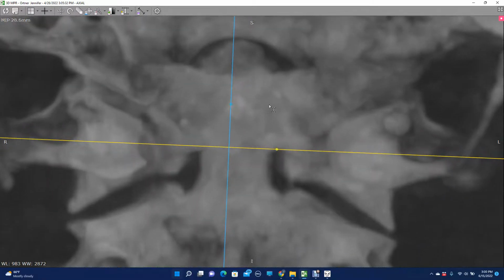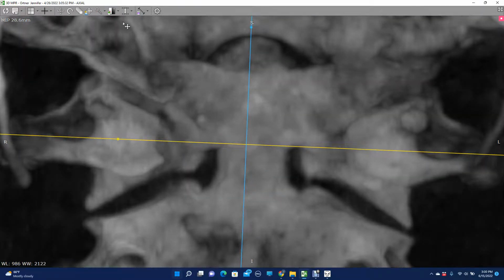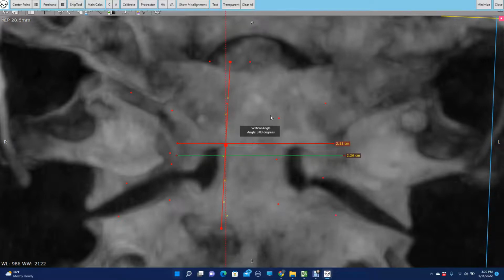What we're going to do is get this image totally ready to be measured, play with any type of shading you might want. The only thing that's super critical here is that we use the measure tool to drop a straight line. It has to be flat, so hold Shift key and drop it. It can be anywhere, any size. Just make sure it's not over the joints you're trying to measure. And we will open up the toolkit again.